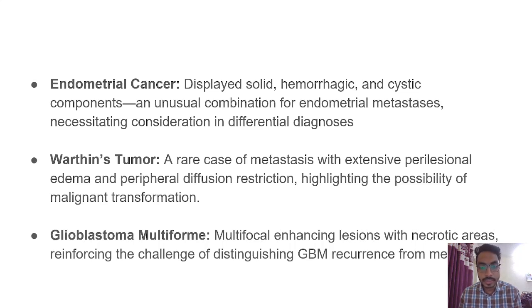Warthin's tumor, a rare case of metastasis with extensive perilesional edema and peripheral diffusion restriction, highlighting the possibility of malignant transformation. Glioblastoma multiforme, multifocal enhancing lesions with necrotic areas, reinforcing the challenge of distinguishing glioblastoma recurrence from metastasis.